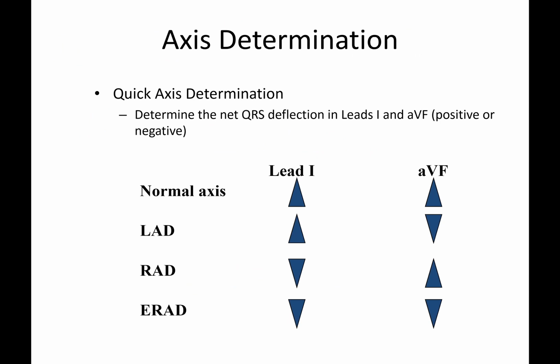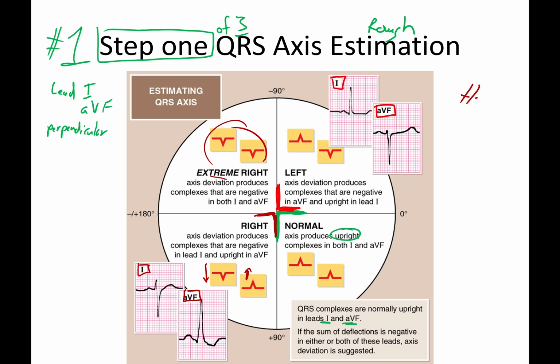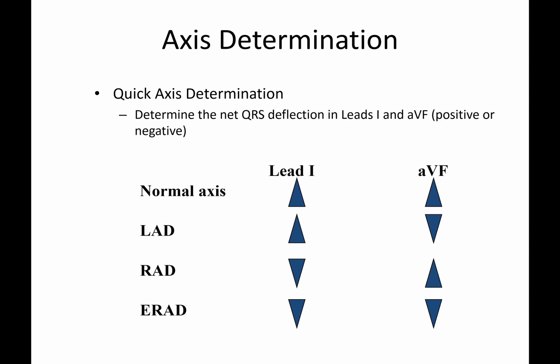For those who like arrows instead of that picture before, and again, this one is from your handout. You'll just want that laying front and center for the rest of the day, because it's going to be pretty necessary to everything that we do from now on. This is just a different layout for those that prefer to see them this way.